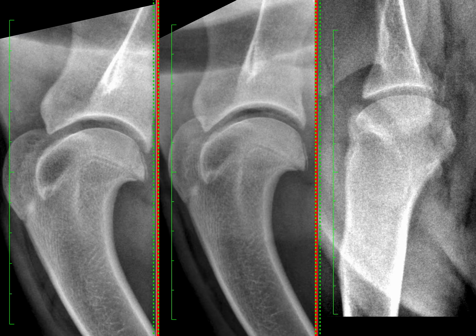Today's example is a 1-year-old female crossbreed dog presenting with lameness of the left front limb. Once you have reviewed the radiographs using your systematic approach, then you are ready to watch this video. I will highlight the most important findings for the left shoulder in this case, and I'm going to start by taking a closer look at the humeral head in this mediolateral view.